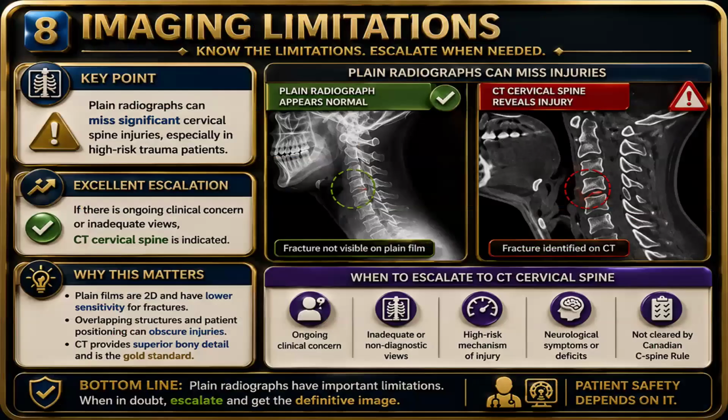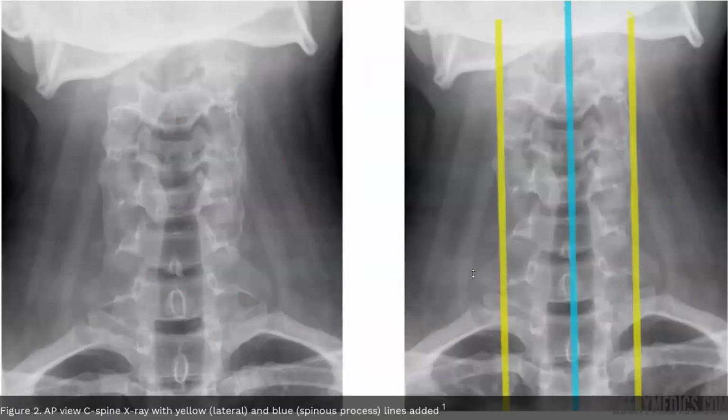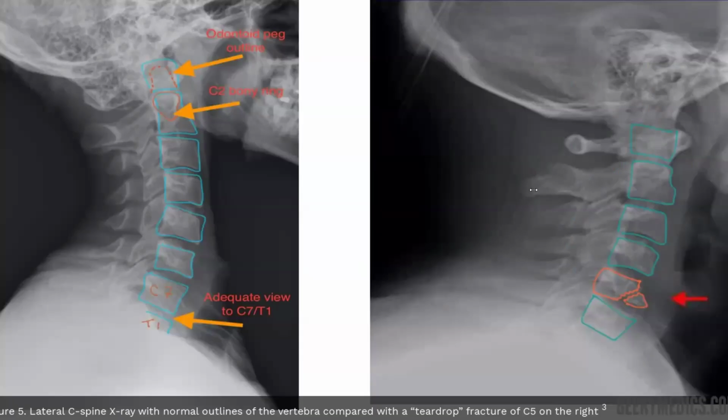Is this one adequate or inadequate? Adequate. Accurate? Not accurate. And what is this fracture? Teardrop. Which vertebral body?